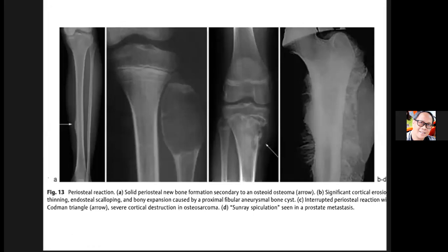And the second image here is an aneurysmal bone cyst. Okay, so there is expansile change, and you may or may not have intact cortex. But what is obvious here is there is sort of a ballooning or expansile change in the area of the lesion. And that's why a lot of pathologic fractures occur in benign lesions too, because even if it's a benign type of lesion, the bone is still weakened by the growth.